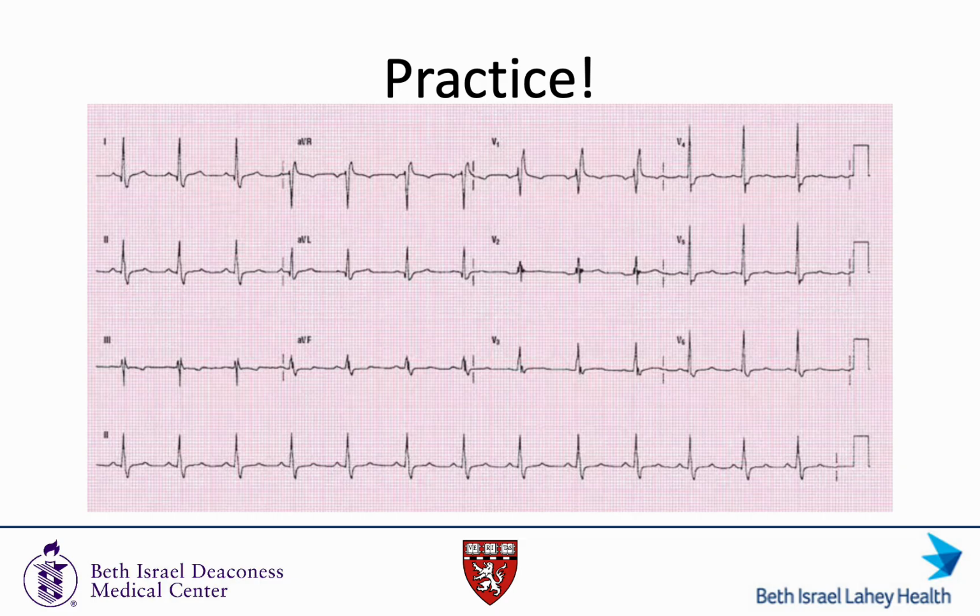Now it's time for some practice. This EKG will look pretty familiar to you if you had a chance to look at the sample EKG earlier. If not, take a second to pause the video so that you can look at it yourself before Dr. Gavin goes through it with us.